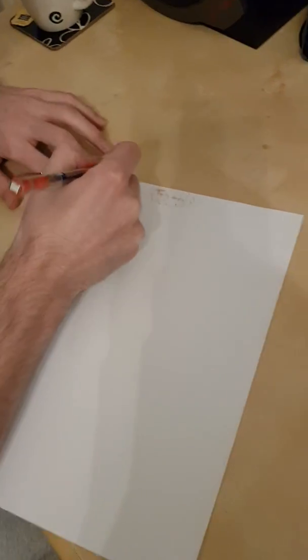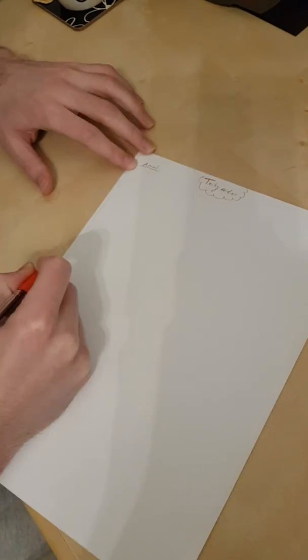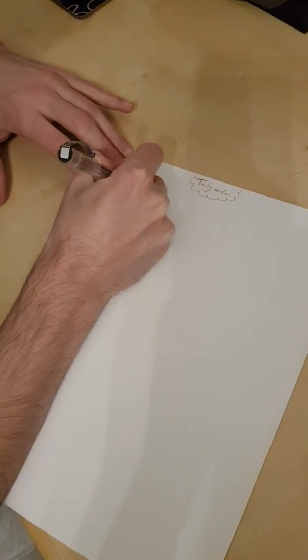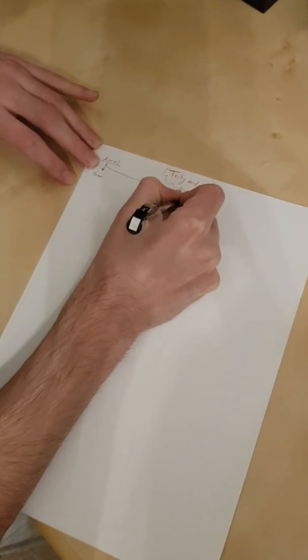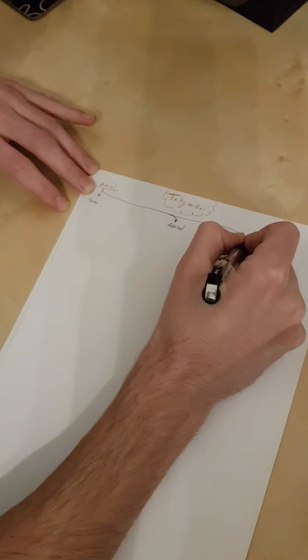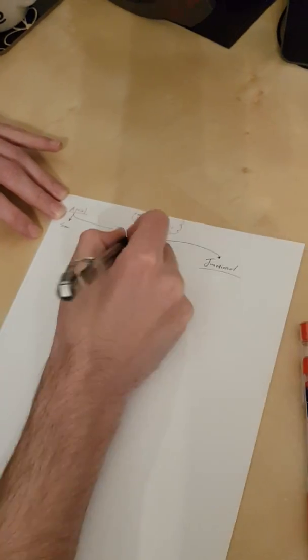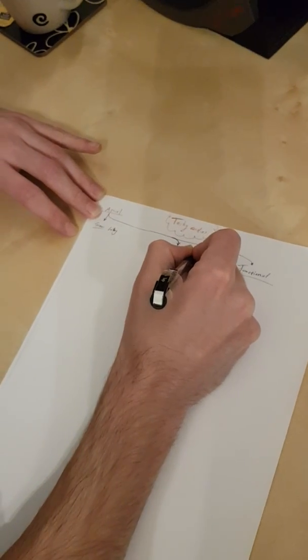So we're going to talk about tachycardias first, as we said. First, let's talk about atrial tachycardias. The main types that we have are sinus tachycardia, atrial tachycardia, and junctional tachycardia. Now, junctional can be considered as a subtype of atrial tachycardia. Sinus tachy, okay.